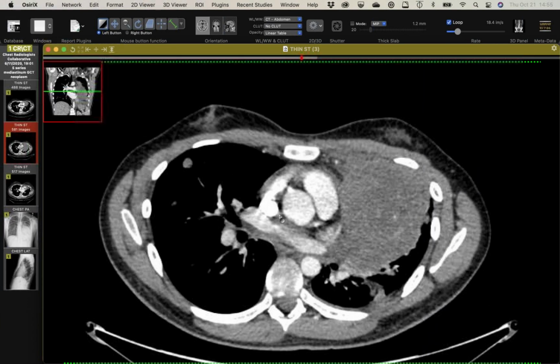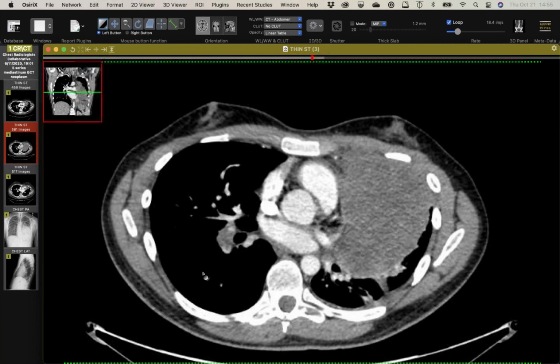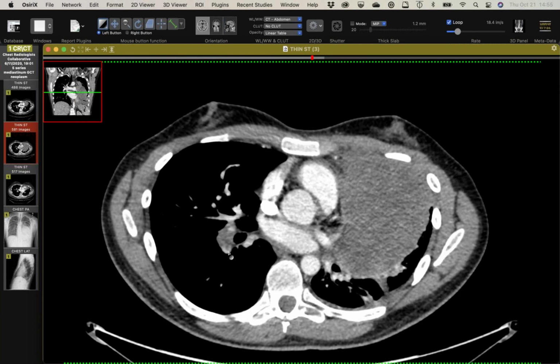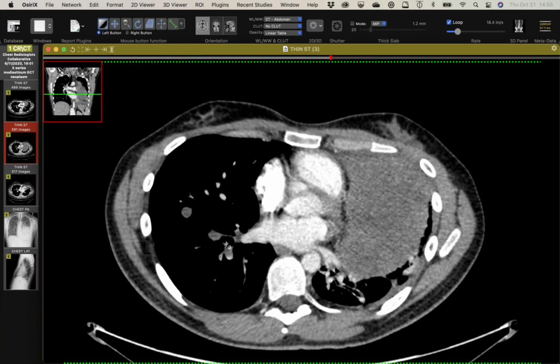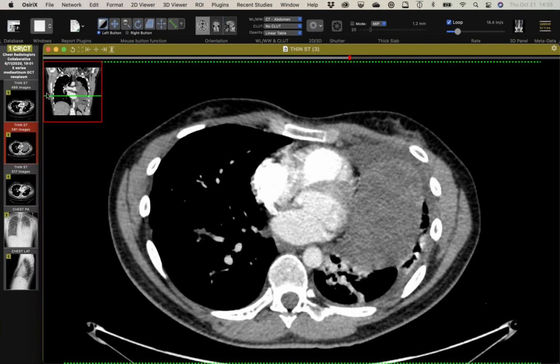And this was biopsied and it was a non-seminomatous germ cell tumor. He's got some PE too. I wonder if some of this is maybe even embolic tumor from that vein invasion, because it looks pretty ugly, not so streaky like typical PE, but who knows. Anyway, he got some chemotherapy.